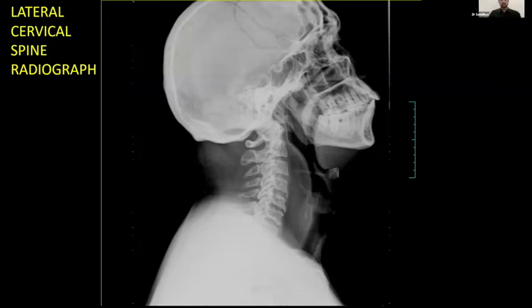Okay. So is there any reference point, say in reference to the vertebra? What is the maximum allowable size? See, at any level, it should not exceed the height of the vertebra. That is usually taken as one of the landmarks.